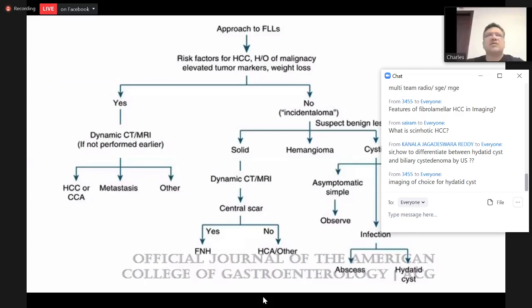And sclerotic HCC is the HCC that shows extensive fibrosis, and again, sclerotic HCCs may not show the classical imaging pattern of classical hepatocellular carcinomas. They might retain contrast. They may not show the classical washout. They might retain contrast and behave similar to a cholangiocarcinoma. And you might need a biopsy there to differentiate it.